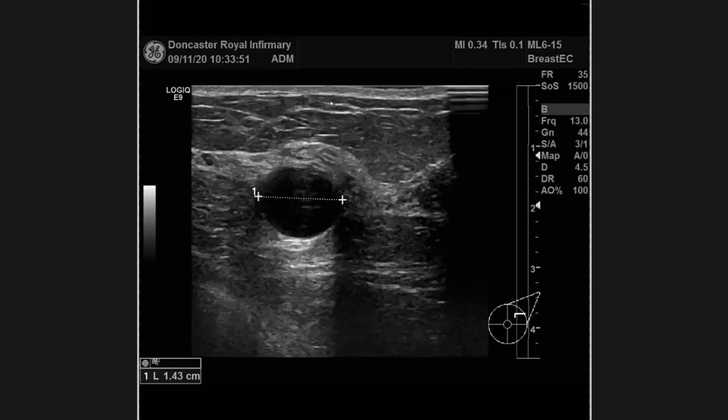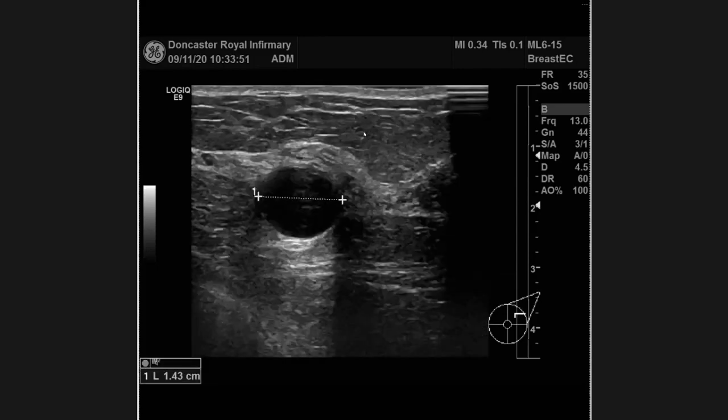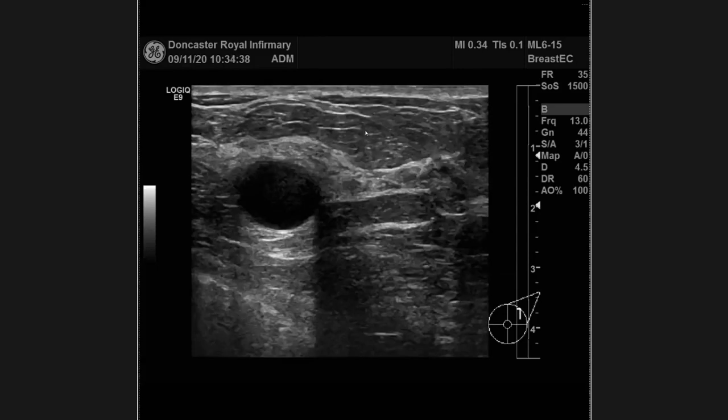composition of this lesion. And I'm provided with the transverse ultrasound of the breast, of the same region. This is a very well defined and anechoic lesion with significant posterior acoustic enhancement, rounded and small. There is no posterior acoustic shadowing and no abnormal calcification within this. So likely this is a benign lesion, likely a breast cyst, BI-RADS 2.